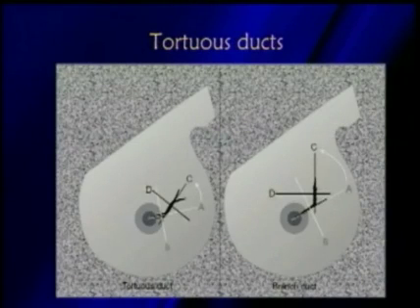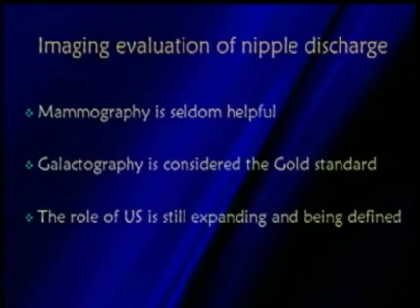The ducts of the breast can be very tortuous, so later on in this lecture I'll show you some different maneuvers that can be done to help straighten out the tortuosity of the ducts that we run into in breast ultrasound. Imaging evaluation of nipple discharge.